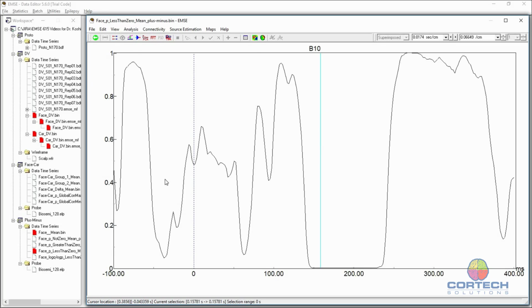What we can see, so these are uncorrected p-values. For that reason, it looks different than the corrected p-values we got in the permutation test. But what we see here is a very stable range of p-values around 200 that are very small.